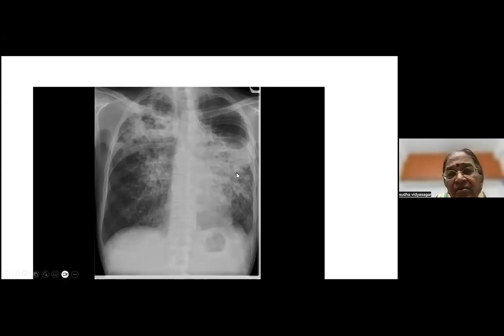Pneumonia. Okay. Where is the pneumonia now? Bilateral heterogeneous lesions, consolidation. Doesn't really look like a consolidation. A lot of fibrosis going on. You can make out some strand kind of things, isn't it? So pneumonia will not be so haphazard, right? So there is probably a bulla here. It could be a cavity also. There is an extensive fibrosis here also.